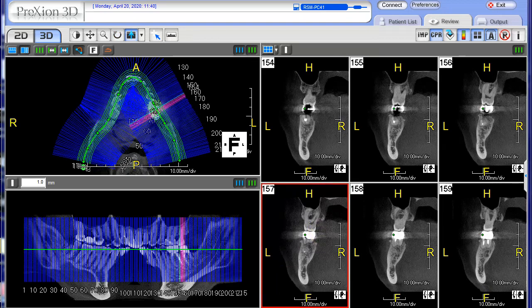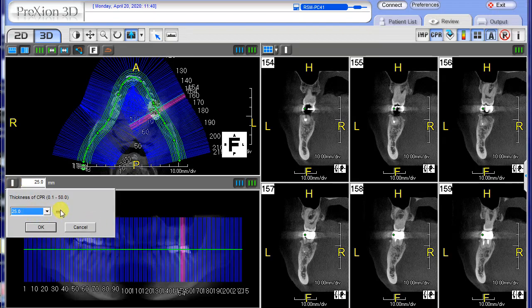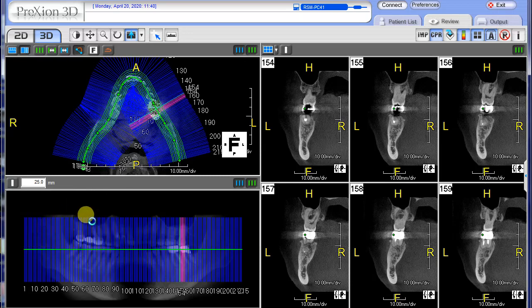Your panel image has a gappy look here, sort of a gap. This number 1 refers to the thickness of the panel. You could change this, either highlight the number and pick a different number, or you can use this little down button here, click it, and it'll display the list. And then I just usually go down and pick 25, click OK, and then let this update. So this will thicken up your panel, and then you'll have your panel image.